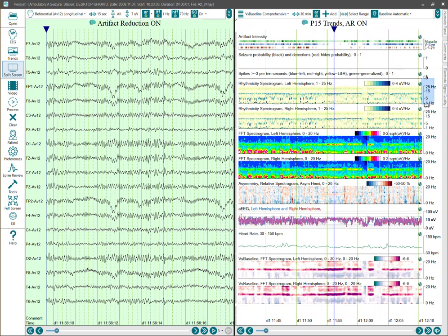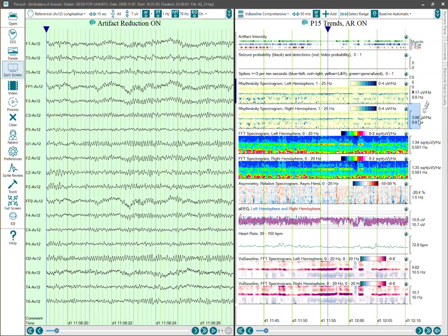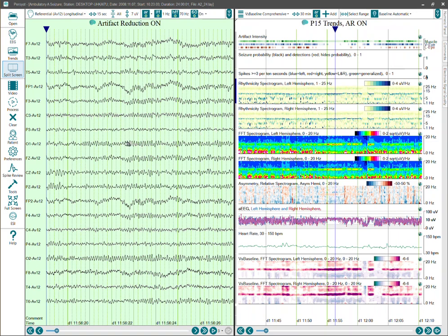And the way we're scaled here on the right, 1, 5, 15, and 25, the lower part of this is expanded. So first measurement option is I can right click on that vertical scale and show values. And here you can see at this point for the trend it's showing 9.9 hertz for both left and right. So that's one way you can measure alpha. You can just go to it in the trends and you can drop a cursor and right click and show values. Method 2 is you can actually do some measurements on the EEG page itself.